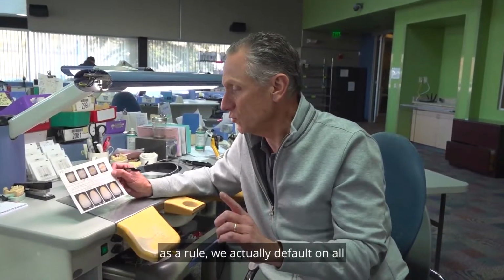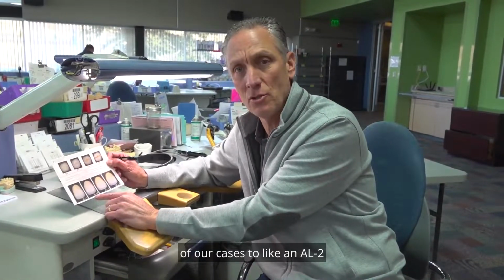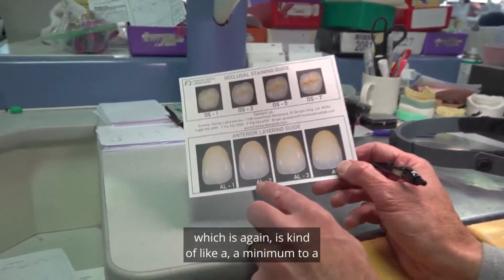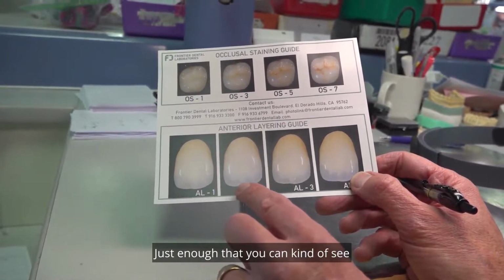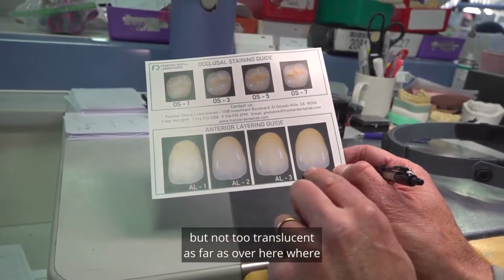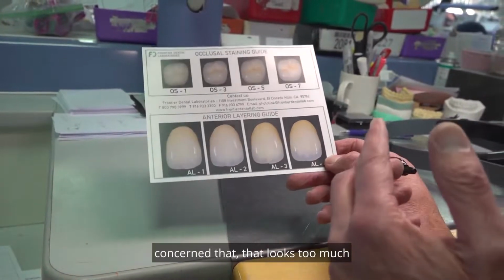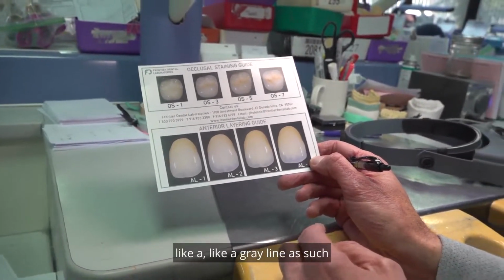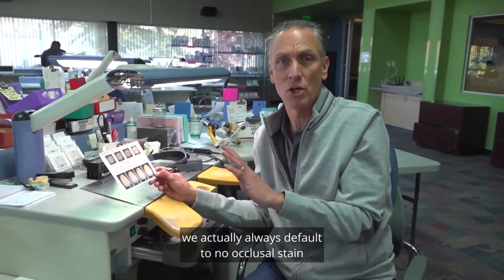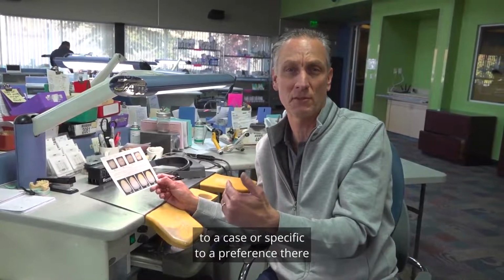As a rule, we actually default on all of our cases to like an AL2 incisal translucency here, which is, again, kind of like a minimum to a moderate type of look. Just enough that you can kind of see some of the mamelon developments in there, but not too translucent as far as over here, where the people might get a little bit concerned that looks too much like a gray line and such. And again, for the occlusal staining guide, we actually always default to no occlusal stain unless you ask for it there. It might be specific to a case or specific to a preference there.